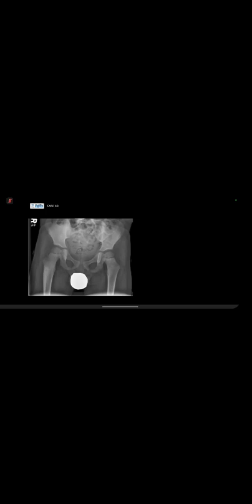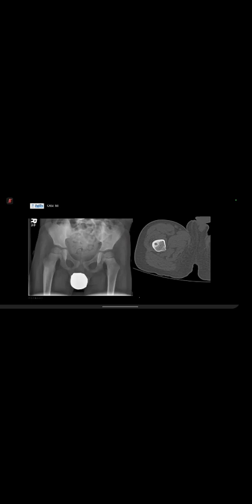This lesion would show me the nidus, the sclerotic lesion, but what would be more apparent is an edema of the bone. Okay, so you tend to see on the MR the reaction, diffuse marrow edema. Which modality would clearly show you the nidus? Bone. So for nidus, it would be CT.